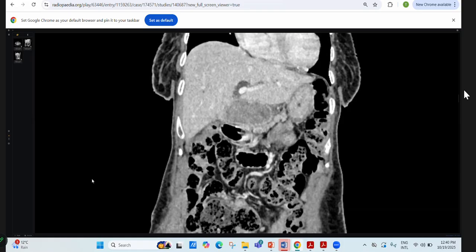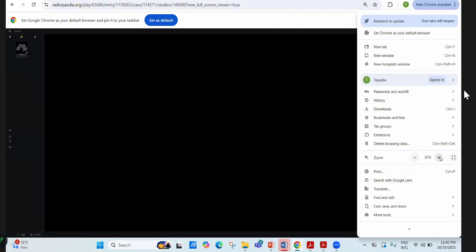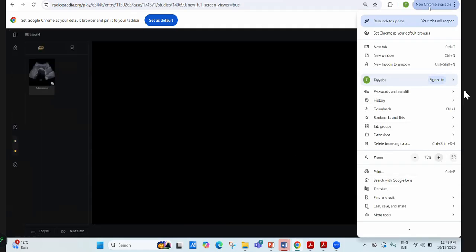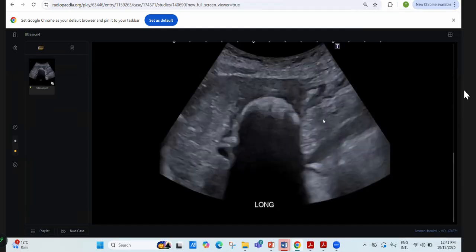If you turn off the findings, like the zoom a bit, because it's so small now. Ma'am, 1.5 minutes left. We can have a next quick case if she will be quick. Don't go to the next case. Go on the ultrasound of this image, and then we'll go.